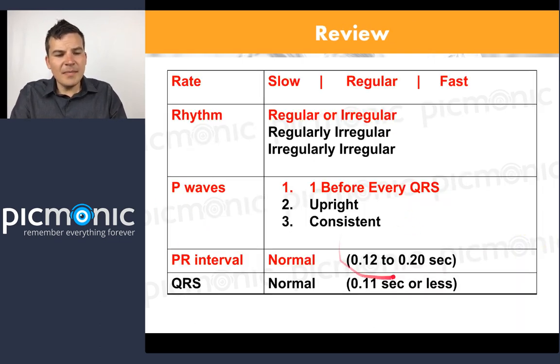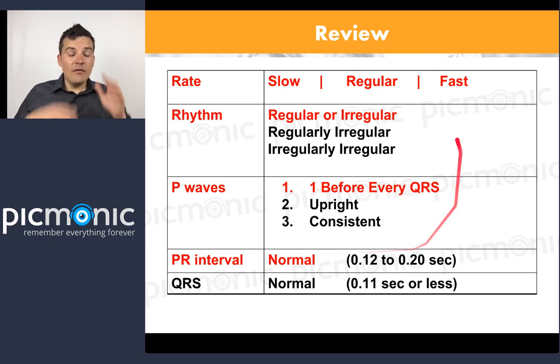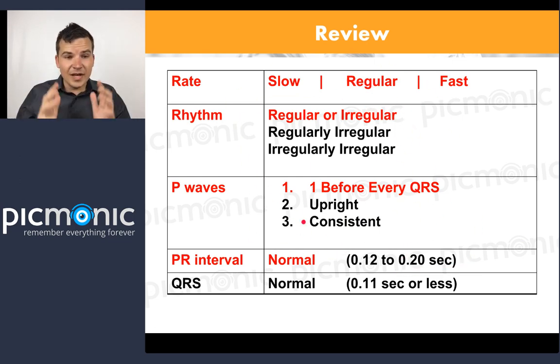So here's our same review of going over what you need to know. Follow this same process. Just do it. What's the rate? Is it slow? Is it regular? Or is it fast?